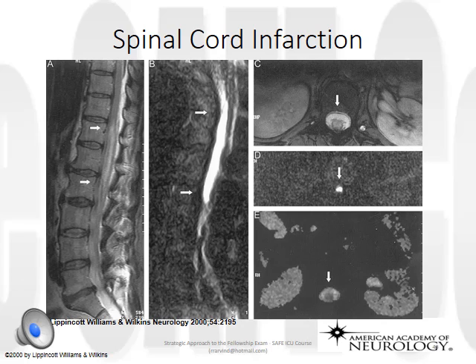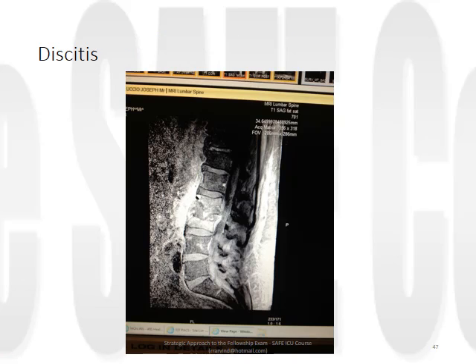So this is central infarction here, which is a bit unusual following a AAA repair. That would be anterior spinal artery territory, so it's a slightly unusual pattern for there to be ischemia.